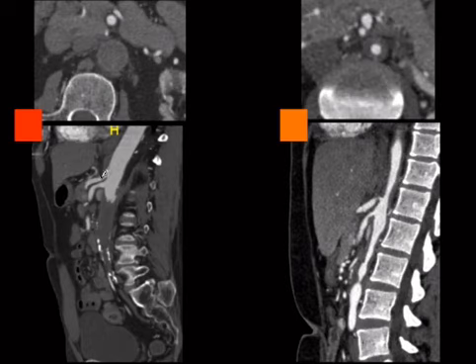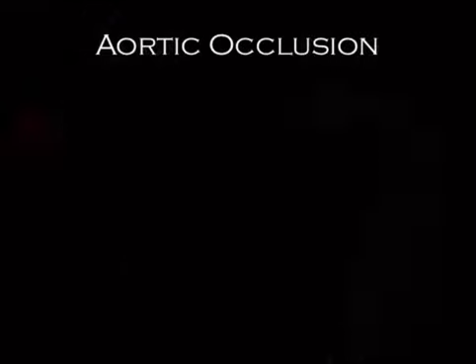I would say, this person's old. How do you know they're old? I can tell because I see a little endplate spurring here, degenerative change in the spine. I can see intimal calcifications there. Young people don't get that. This person looks young to me. Look how clean that spine is. That's a young person's spine. I'm seeing no intimal calcification at all. I'm inferring this person is young, so this person has Takayasu's. This person is old, so this is just atherosclerosis.